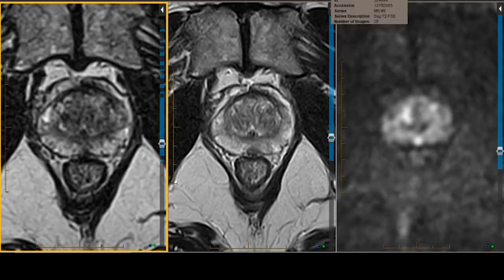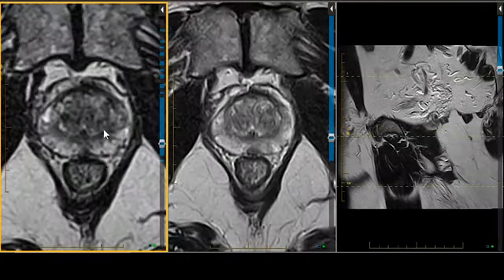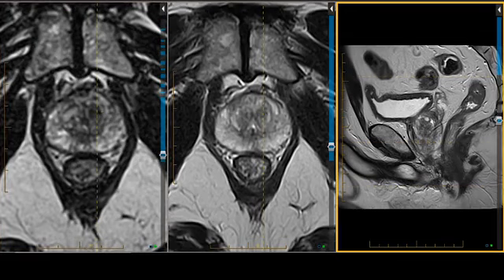Let's take a look at these areas in the sagittal projection. Let's go to our nodule down low. Here it is. And there it is in the sagittal projection. Better seen without balloon inflation. We don't have all the motion artifacts that we described at 3T. We don't have the susceptibility artifacts that we saw at 3T.